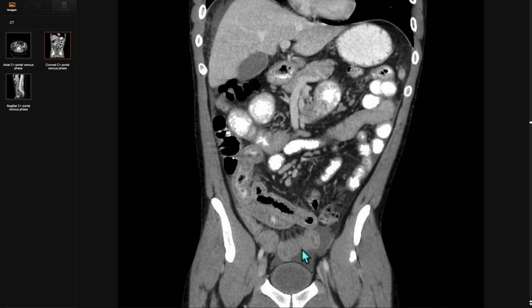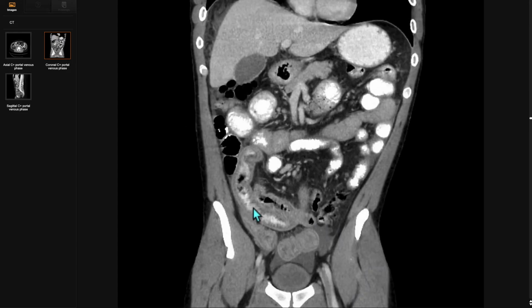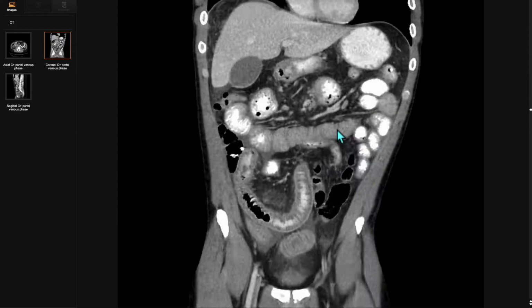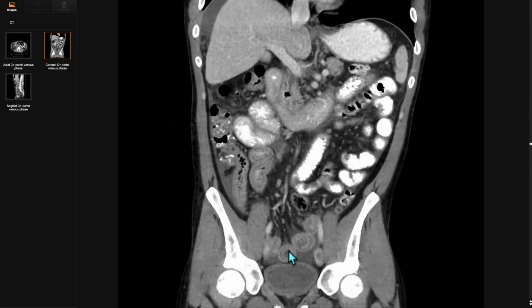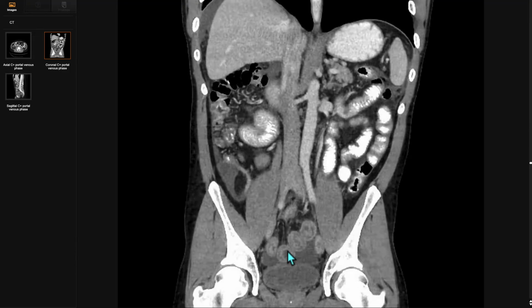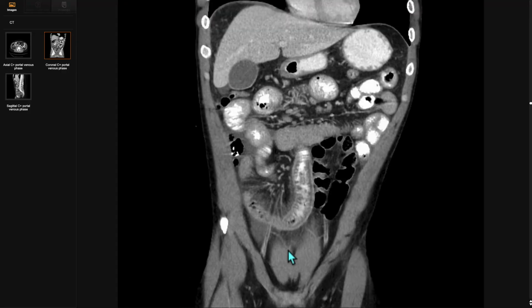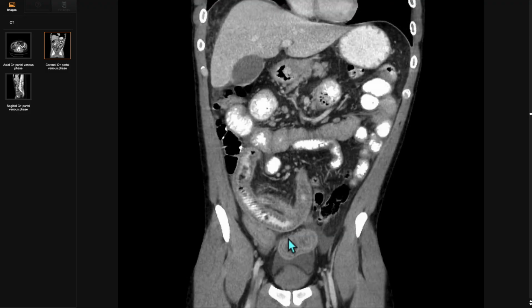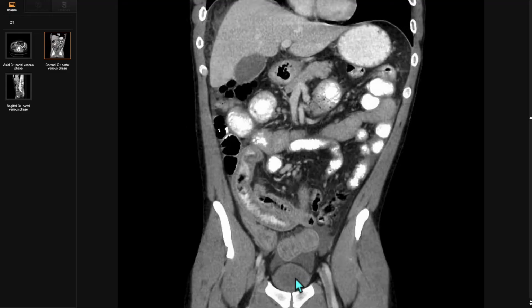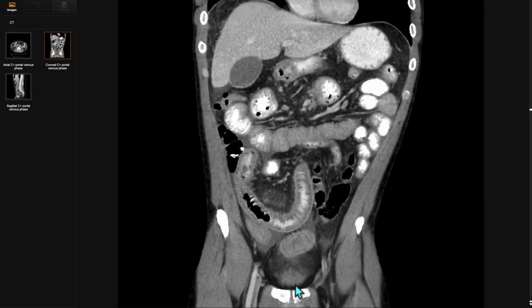This next case looks a lot like the last case, with similar imaging findings of long segment small bowel inflammation, some dilated loops upstream, and that similar appearance of the target sign related to mural stratification. This patient also came to the emergency department and had a several-month history of waxing and waning abdominal pain and was largely a puzzle to the team to manage at the time. The patient turned out to have elevated peripheral eosinophil levels and eventually underwent a biopsy which confirmed eosinophilic gastroenteritis, which is often self-limiting and can be effectively managed with steroids.